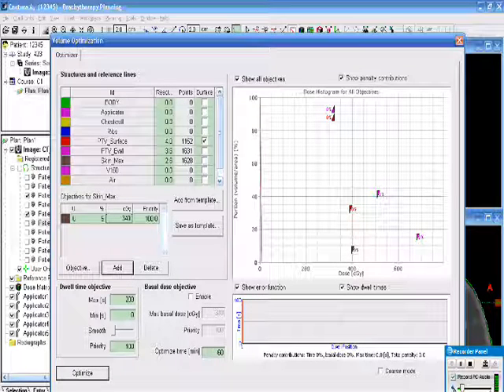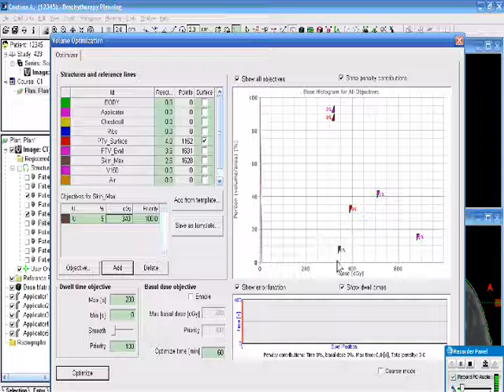And when I do that, you can see here's the marker for the skin, and we'll want the skin DVH to go to almost 0 by the time it gets here. Oftentimes it'll get a little bit higher, and we'll have to fiddle with the optimization in order to do that. In this case, we're so far from the skin it won't be interesting. It'll die way down here.